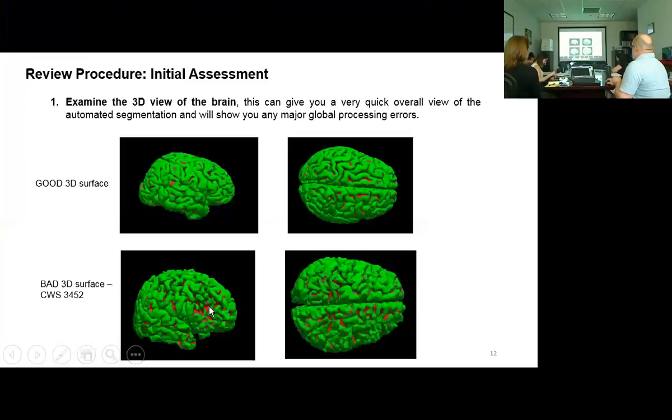If you contrast that to a scan down here, the surface is relatively smooth too. If you look down here, you see a lot of bumps, kind of more jagged edges. You see a lot more red, so the sulci are exposed. Here's a typical looking temporal lobe where it comes down and it's nice and round. Here it's truncated. It doesn't extend as far forward as it should, and it's jagged.